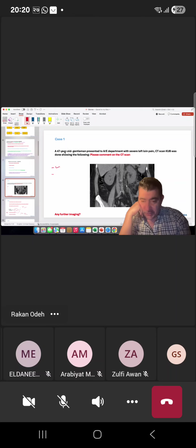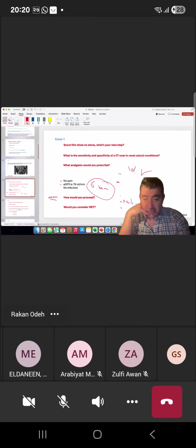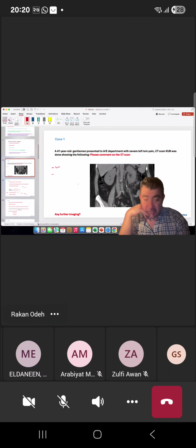And you did comment on the CT scan very well. You mentioned the stone, then you mentioned what's proximal to the stone and what's distal to the stone. So you talked about the mild hydroureter. I would also mention a little bit, always comment on the perinephric area, a little bit of perinephric fat stranding. And you did comment on what's distal to the stone, that you want to see the bladder, which is very good.